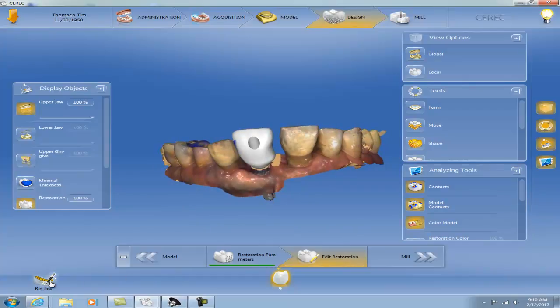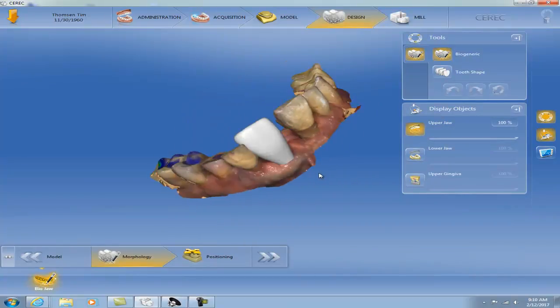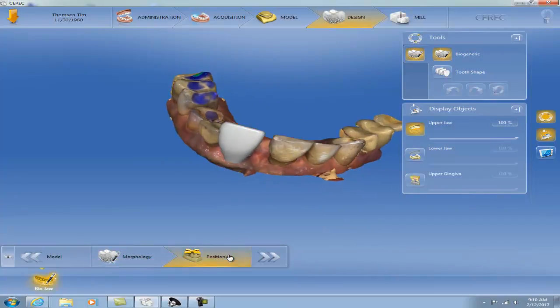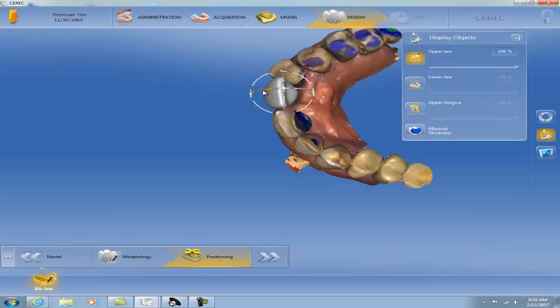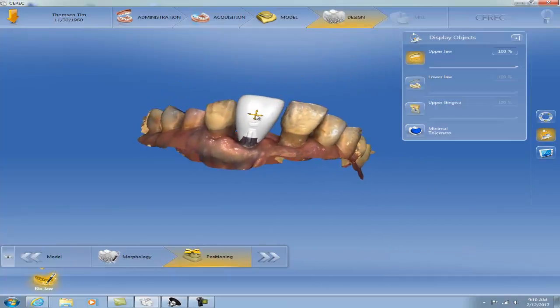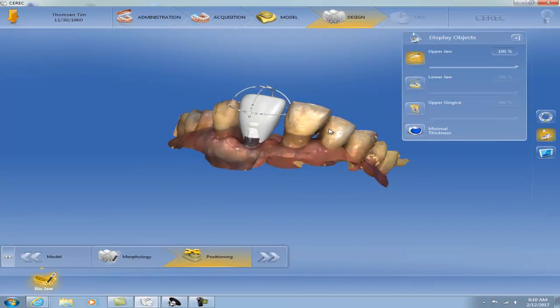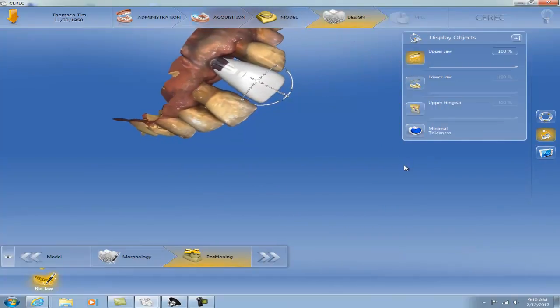What I usually do is use Biojaw. I want to see how I can improve the position of the restoration, so we go to positioning. Let's align with the neighboring teeth with the same inclination. It's very challenging to do cosmetically because the adjacencies are not so great, but we can do as much as we can.